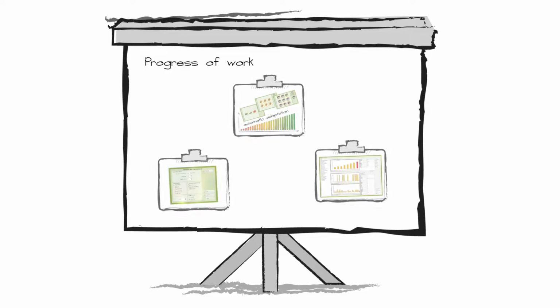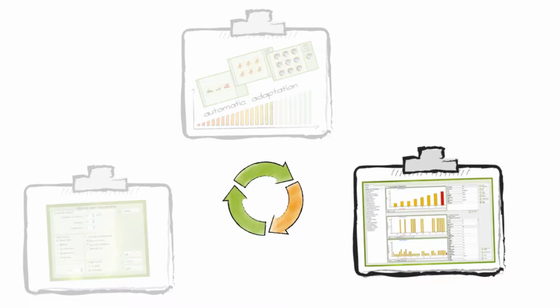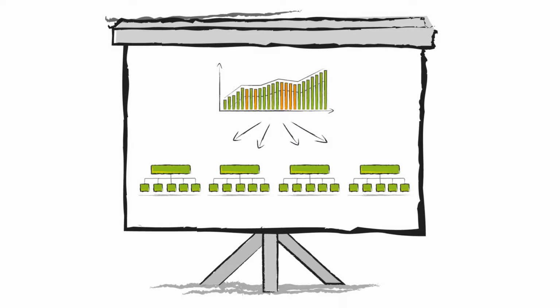In summary, the progress of work for one RehaCom module is now shown. The patient starts working with RehaCom at an easy level. The auto-adaptive mode keeps the difficulty of training at a level appropriate to the abilities of the patient. After therapy, the therapist analyzes the training results. When any adaptation is needed, it can be made in the Parameters menu before the next therapy session starts. Your knowledge about the therapy module, Attention and Concentration, can now be transferred to all other RehaCom therapy modules because they follow the same principles and structure.